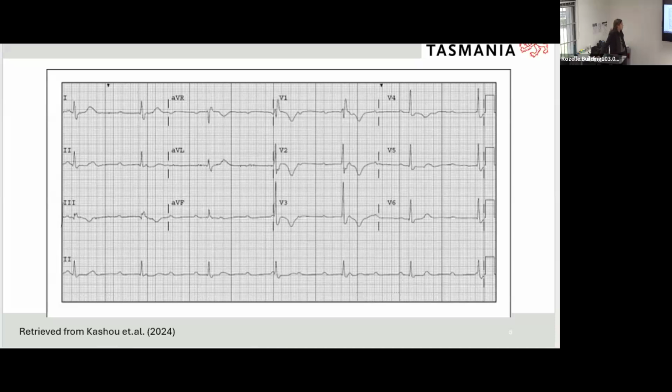So that is a very difficult one to determine, I would agree. But with your T wave, sometimes the T wave can hide a P wave firing as well, but you won't see then the atrial depolarization because you'll be looking at the ventricular repolarization, which will be overshadowing the atrial depolarization. So you won't be able to then see it.